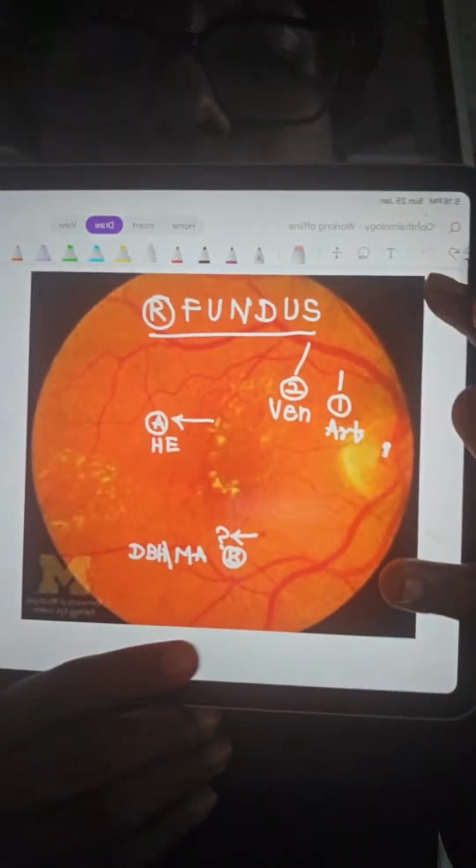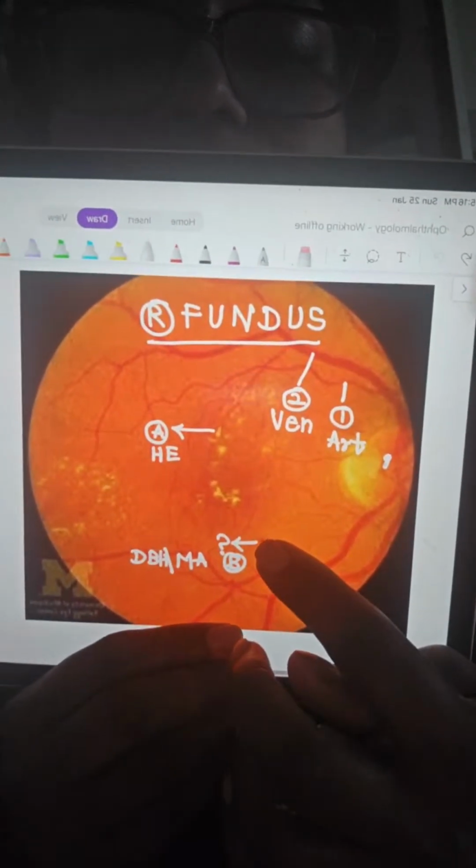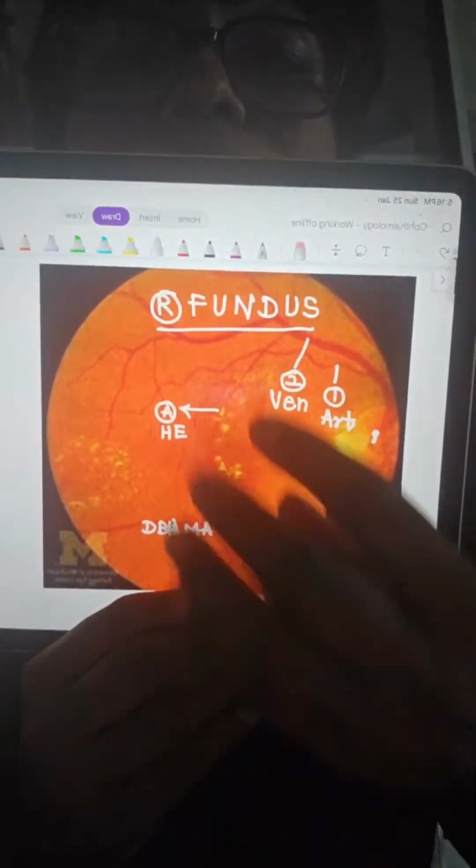But again, going back to the other fundus image that I was showing you. So please do see these red dots and the yellow dots. So when you have just red dots and yellow dots without florid new vessels, that is NPDR. Yes, and please do remember, hard exudates is not characteristic of diabetic retinopathy. It's seen in way more conditions, a lot of conditions. But when you see microaneurysms and hard exudates, then we are kind of sure that it is diabetic retinopathy, because that is more common.